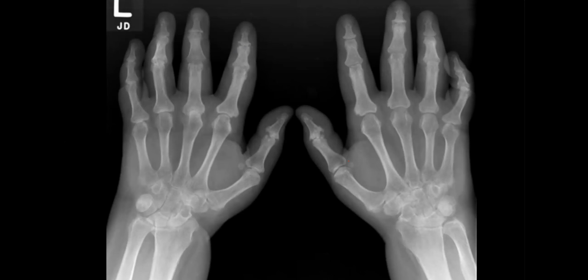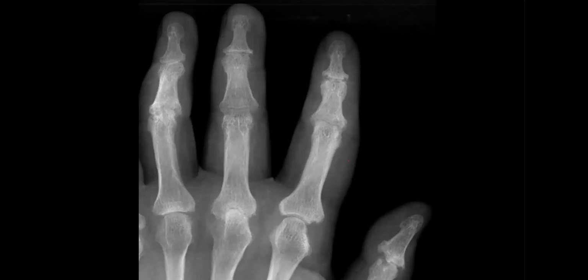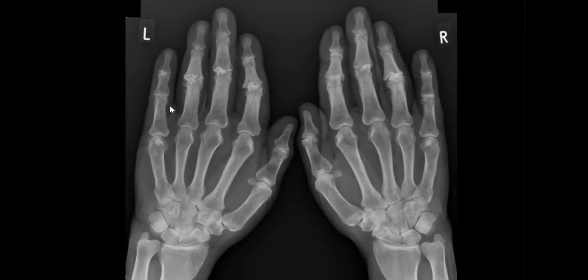What are the causes of distal erosive arthropathy? Sir, psoriasis. Very good. Psoriasis, like this case, just pertinent negative, no acroosteolysis, no soft tissue calcification. This is psoriasis, distal erosive arthropathy, interphalangeal, proximal, and distal, with new bone formation. It's not pure erosions. You see here, some bone formation at the edges. Mouse ears.